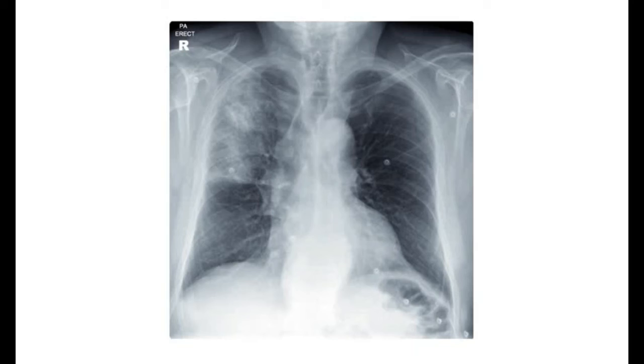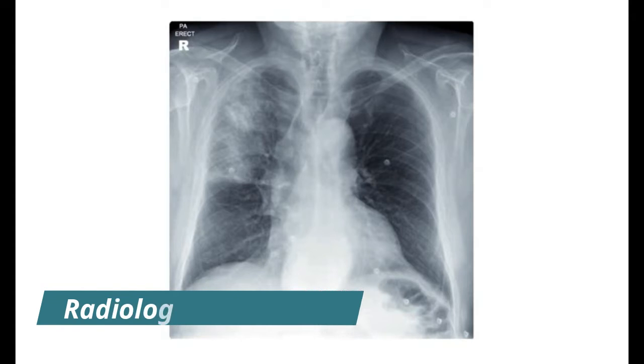This is the chest X-ray of a 70-year-old male with increasing confusion. He has a productive cough and a fever. He has a past medical history of hypertension, angina, and mild cognitive impairment. He has a 45-year smoking history.